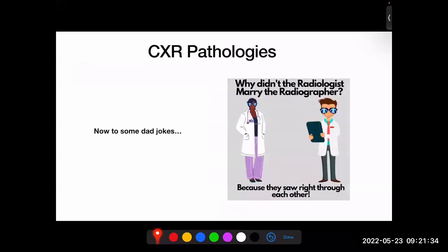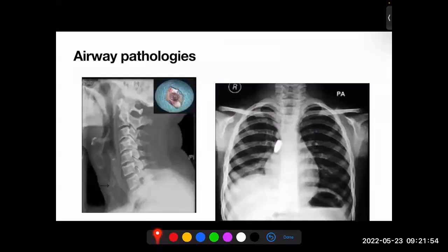I think the part where I am to speak is done. Okay, let's look at the pathologies. I think now is when you people are unmuting. Yes. Somebody, can you guys see the screen? Hello. Yes. Who is speaking? Can you take the first picture? Let's give this one a name.